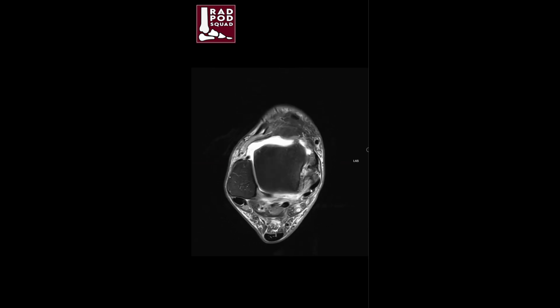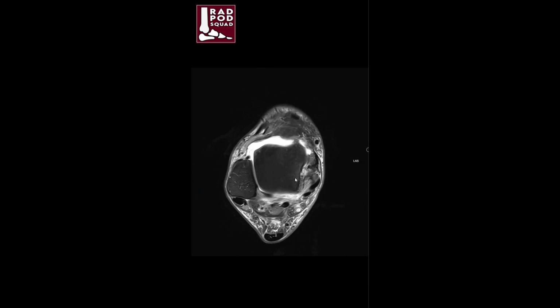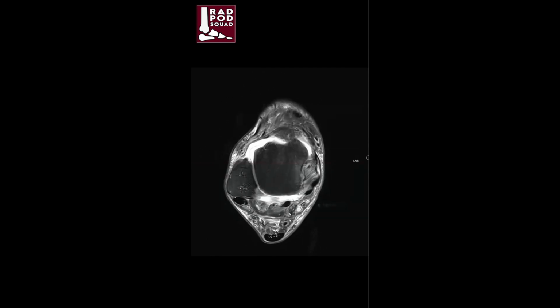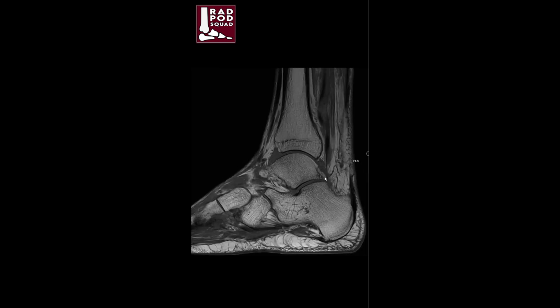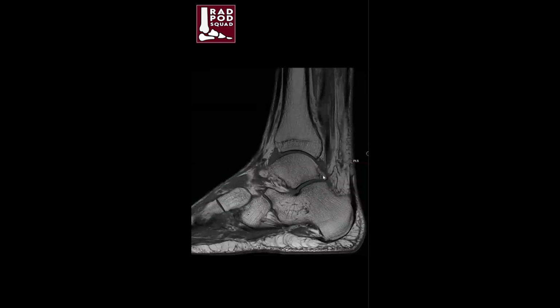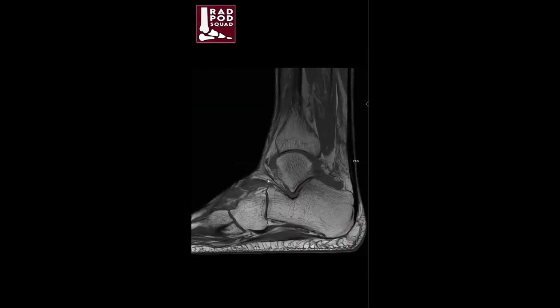So when I think about that, and the degree of that we're seeing here, I agree, Abu, I would definitely want to check and see, does this patient have a reason to have extra inflammation? And some things that make me think the patient might have seronegative inflammatory arthritis is this extra rind of bone, this enthesopathy that's occurring. So that's an interesting phenomenon, and I'd want to do a laboratory correlation for that.